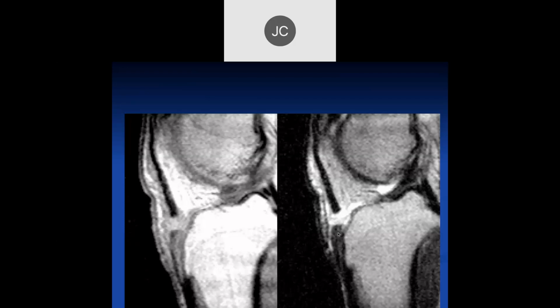normally are in abnormal tendons. In fact, there's a cadaver study of the shoulder that we'll talk about when we get to the shoulder, where they looked at the histology of supraspinatus tendons in a large series of patients who went to surgery. And they found that 100% of the tendons that tore had evidence of chronic tendinosis in the adjacent tendon. So basically, normal tendons don't tear. In this case, this looks like a normal tendon coming down here, and this was a laceration.